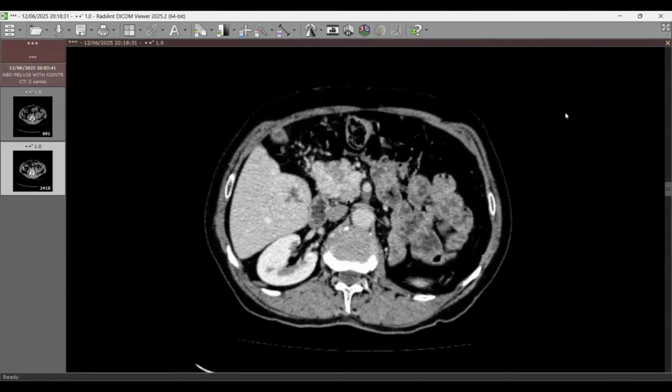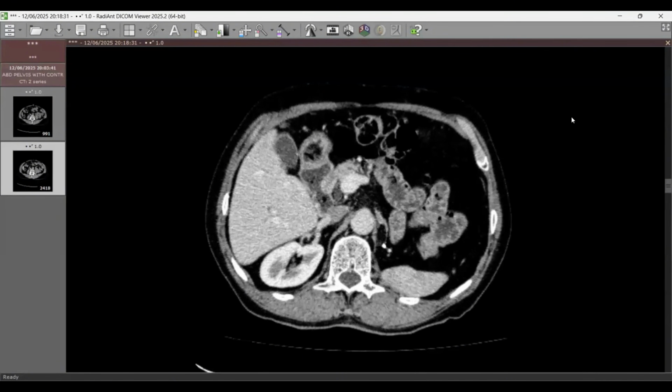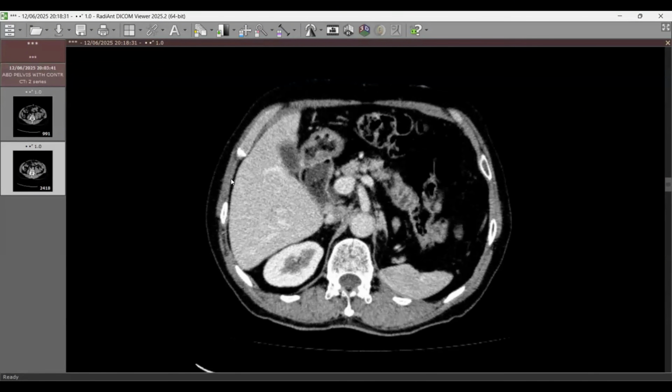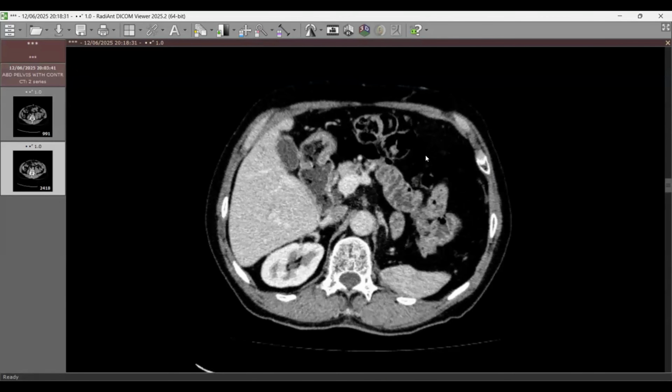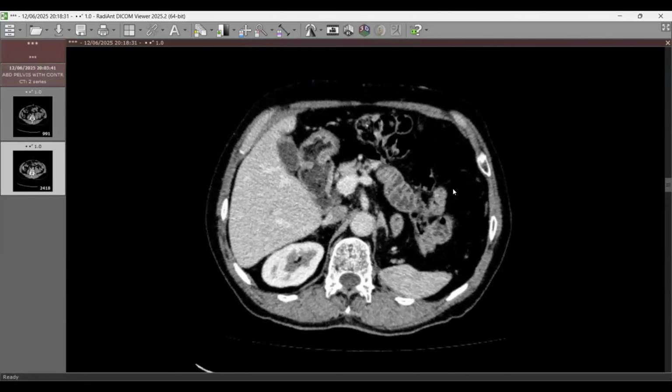I would like to advise an MRI. And how would that help? I believe that this periportal lesion is malignant. I believe that all these lesions are malignant. How would an MRI help? You're right, sir. If you had to confirm whether these were hemangiomas, ask for a delayed image, a delayed sequence. Why go for an MRI in this case?